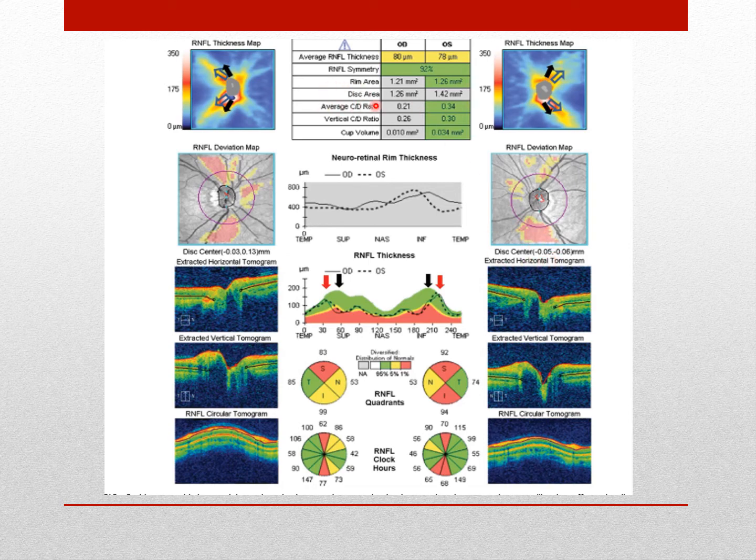When it comes to the optic disc, the OCT manufacturers don't use normative data to compare with for the disc. I don't know why this is. If you do know, please let me know in the comment section down below.